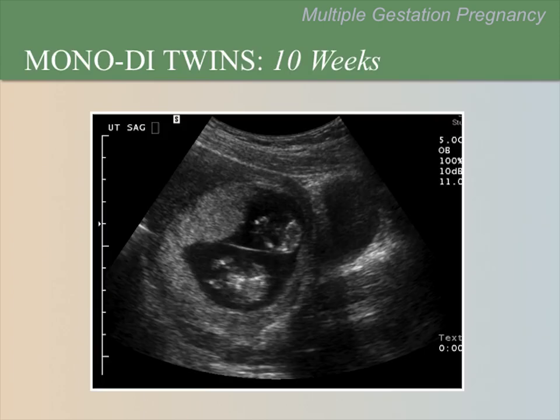This is a typical image from a mono-di twin pregnancy at 10 weeks. What can you see in this image? Please pause the video now to encourage responses.